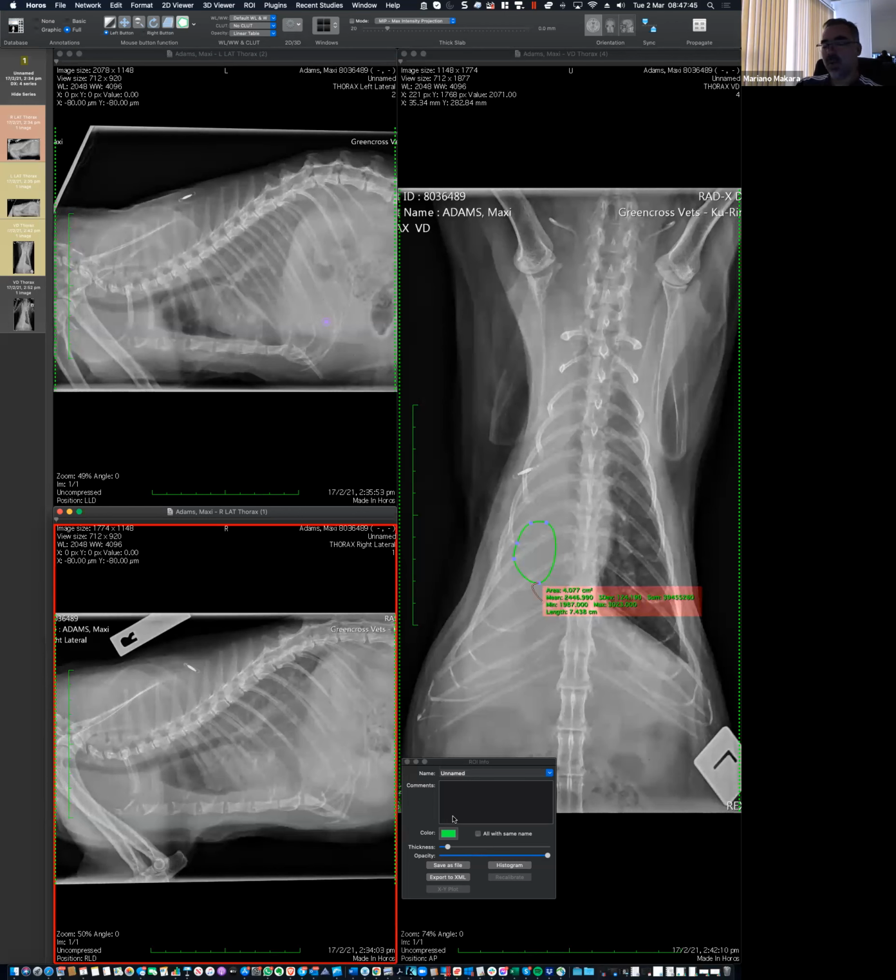Now, I think we are dealing with a completely different situation. I don't think that those rules apply in this case. This animal is only working with one left hemithorax, with the left lung lobes. So I'm not sure how much this play with atelectasis is happening if we are only relying on one lung. And maybe the mechanics of respiration are going to keep that lung from collapsing when it's on the dependent side. And I'm speculating about that.